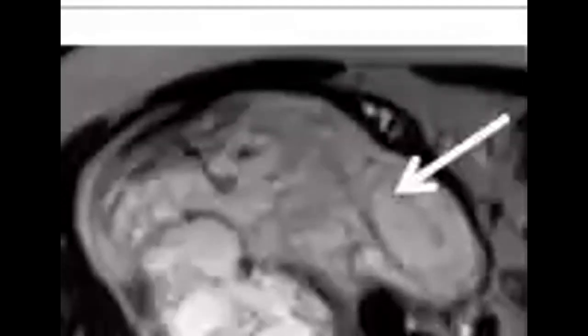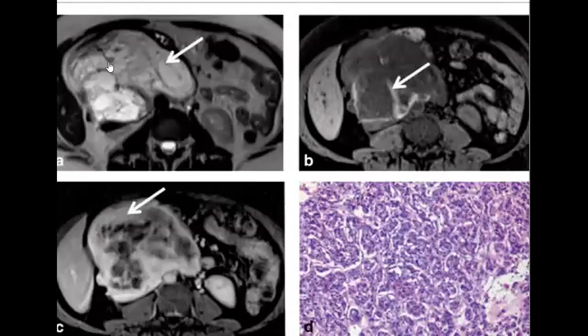And for a single lesion, and it have hyper intense area in T2, and there is intense enhancement again in the post contrast, so very similar to the GIST, and it have this appearance. So you can think about GIST, or here can be neurogenic tumor like schwannoma. Not typical case, and not very common case, but it can be like this case. It is schwannoma.